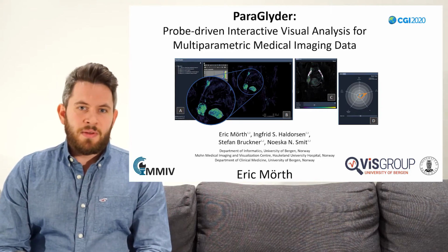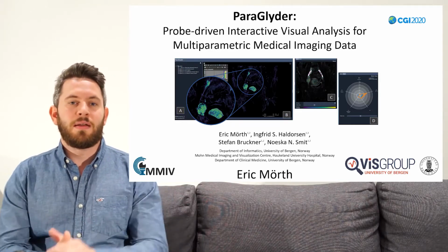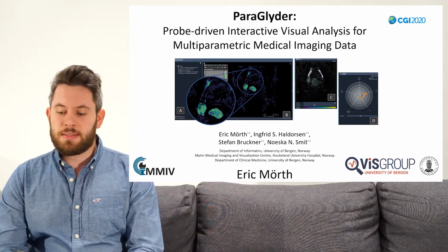Hello, my name is Mörth, and together with my co-authors Ingfrid Haldorsen, Stefan Bruckner and Noeska Smit, I would like to present you ParaGlyder. ParaGlyder is about probe-driven interactive visual analysis for multiparametric medical imaging data.